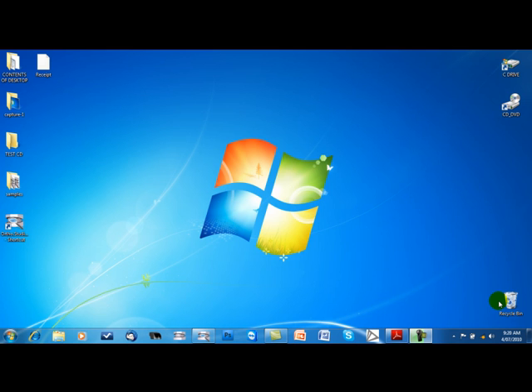If you've got a CD-ROM or downloaded the program from the internet, just run the installer, select the default options, and it will install onto your hard drive. We'll also give you an option of putting a shortcut on your desktop. I suggest you do that. Here I've already pre-installed the program, and here is the shortcut.